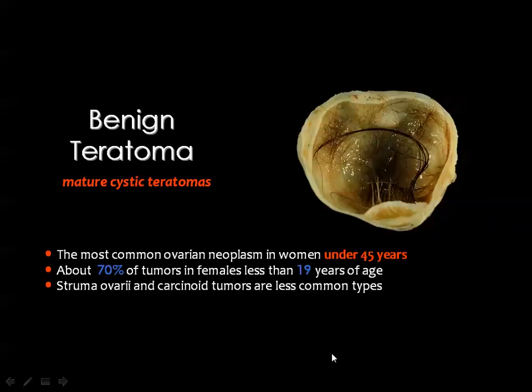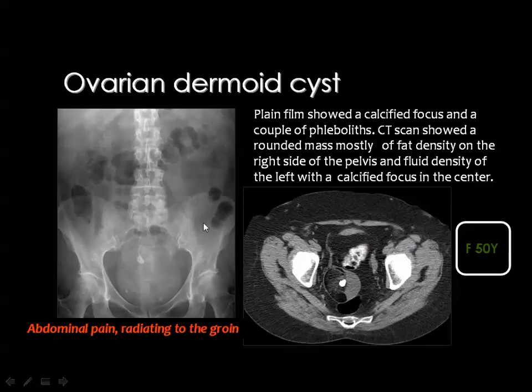Teratoma, you know, it is a benign lesion, also called the ovarian dermoid cyst, and the diagnosis is based on the detection of fat inside the lesion. And this is one of the values of the plain X-ray, and you can see some tooth-like calcification in the pelvis. Then you can diagnose this as an ovarian dermoid, of course, if this is a plain film of a female patient. And this is used many times in the exams, as you know.